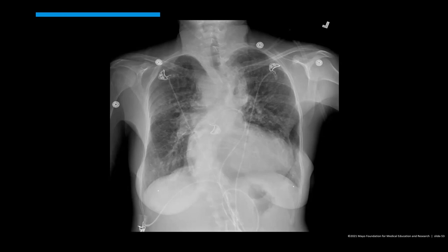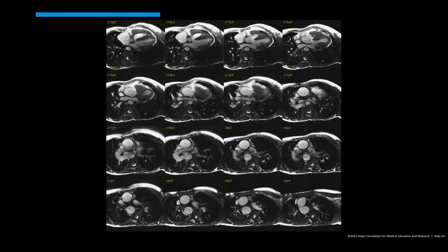Thank you. So this is an abnormal cardiac silhouette. The cardiac silhouette is enlarged. The apex of the heart is elevated. There is a right-sided aortic arch. This might look a little bit like a boot, sort of the moon boots from the 1970s and early 80s, maybe an UGG boot nowadays. So a boot-shaped heart is associated with tetralogy of Fallot, and this is a patient who had uncorrected, previously unrecognized tetralogy of Fallot.